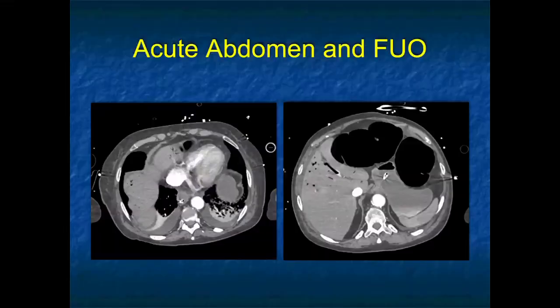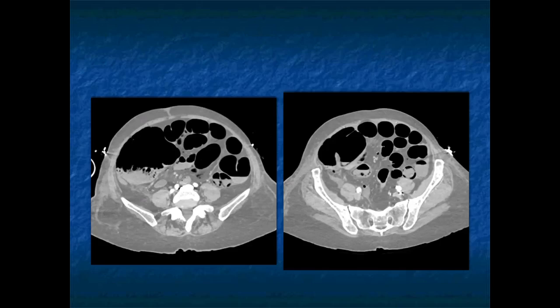Acute abdomen and FUO. What you notice right away is in the liver there are linear densities, which are actually air in venous structures, right? That's the key finding. The patient has portal venous gas. When I see portal venous gas, I've got to be thinking about ischemic bowel, though there are other reasons, including iatrogenic causes. As we scan downward, you can see pneumatosis in multiple bowel loops.